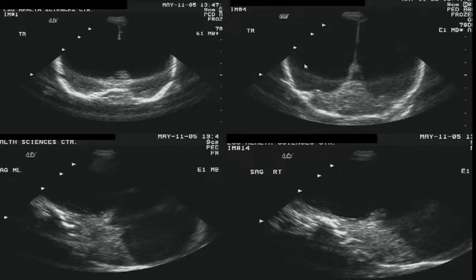And so what happens is where the internal carotid arteries supply most of the cerebrum, except the back inferior part of the occipital, all the rest will be gone. This is not severe hydrocephalus, because if there's severe hydrocephalus, you'd still see a little bit of cortex being squashed around the periphery. There's no cortex here. All the cortex is gone.